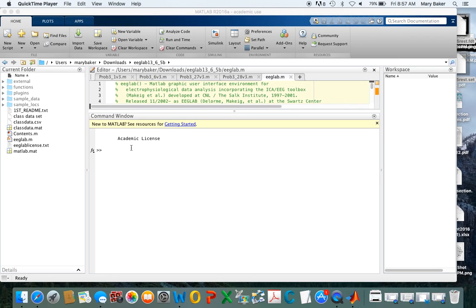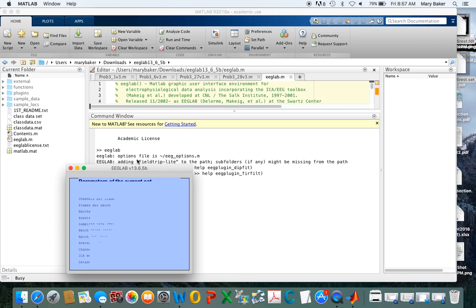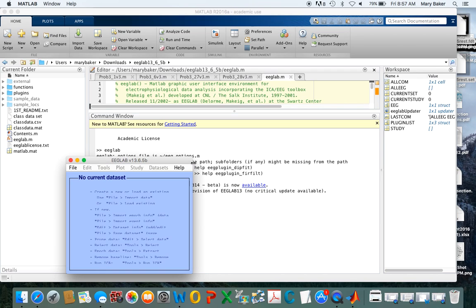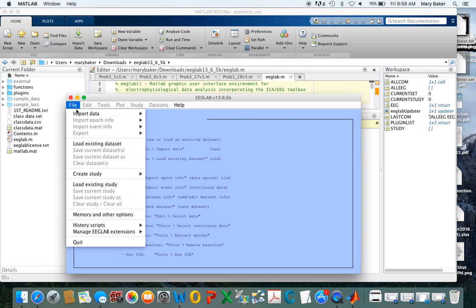Okay, what I want to do in this video, and probably there will be quite a bit of space here in this video where you might get bored. Because we're gonna run an ICA algorithm, which can be kind of a lengthy process. Maybe I'll stop and then restart after we get the results. This is a MATLAB toolbox called EEG Lab. And among other things, it allows us to do independent component analysis.